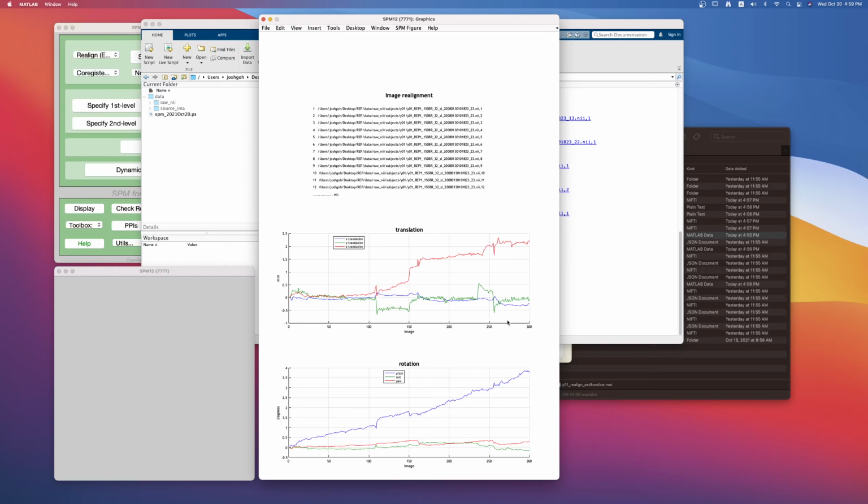Now the important thing is that we know that our EPI resolution, the voxel size, is about 3.4 millimeters at the smallest dimension. So strictly speaking, our criteria should be that if any subject moves more than the size of one voxel, which is 3.4 millimeters, then usually we would be very cautious about using that data, and we might consider discarding that subject's functional data. All right, and we will discuss in class some various criteria about whether to discard or not. But that's the standard.